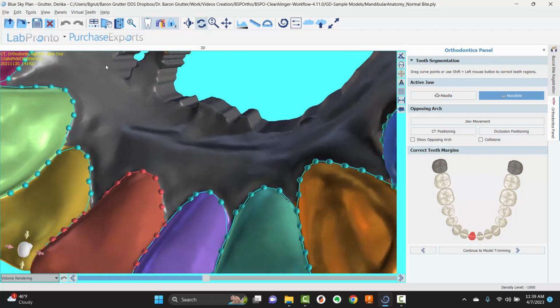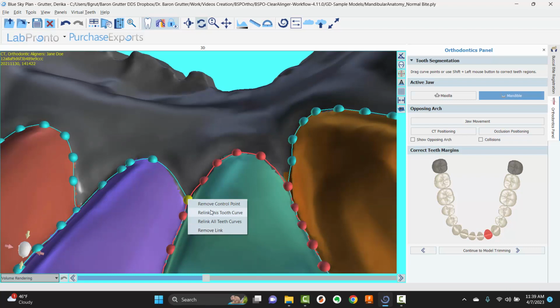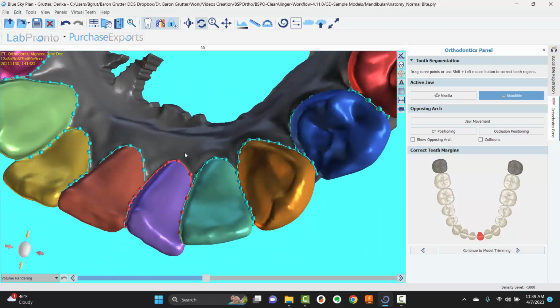It's really not necessary. I don't need to in any of these. But if you don't like something, you can move nodes around. You can actually take nodes and merge them together. And now it's together. You can also right-click and unlink, remove link. And now you've got 2 different nodes again. So anyway, if you need to improve things, it's always possible.